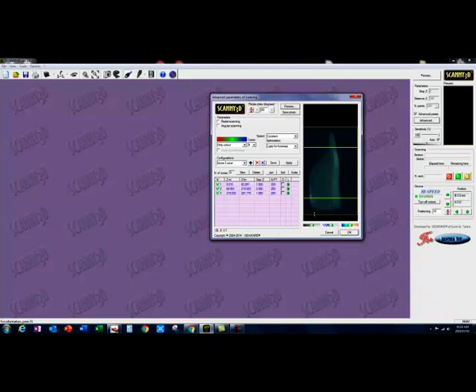Now the reason that we've got these 3 zones is that we want to change the Z step in the bottom and the top zones to be 1 millimeter, and the center zone is going to be 2 millimeters. So if I just click in here and zoom up, I just want to move this line so that you can see a little bit of that stalk from the stand sticking out.